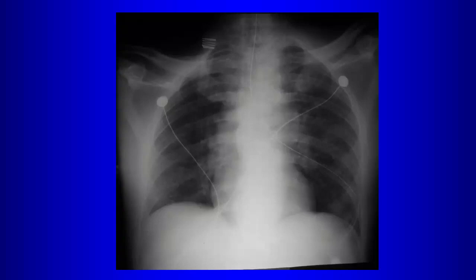Well, that's not the major finding. Yeah, the enteric tube, the NG tube going into the lung. Now, usually we pick this up right away. Why? Search patterns first. Well, that's right, because our habit is usually, we've learned that the first thing you want to look at when you're looking at chest radiographs is the position of lines and tubes. So we've learned to make that habitual, that's the first thing we're going to look at.